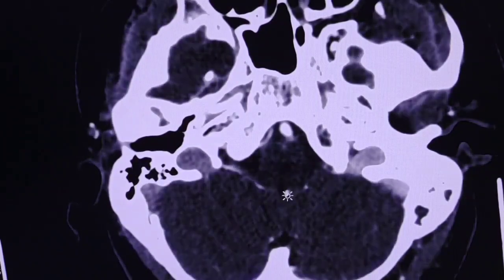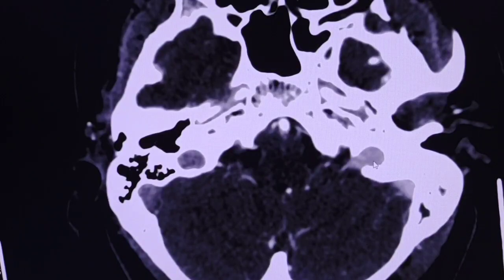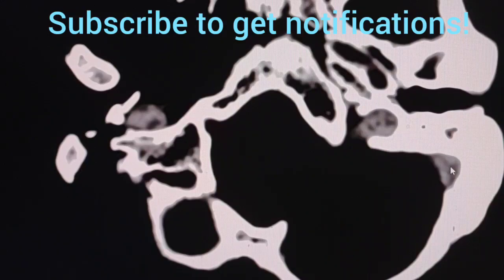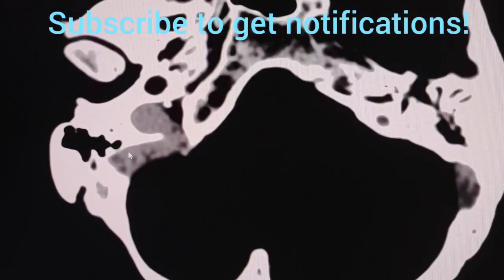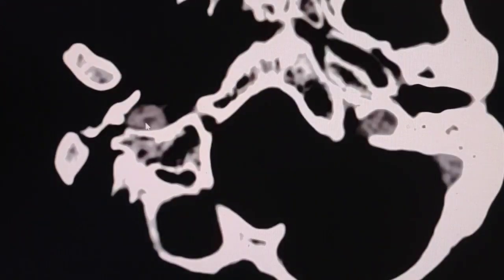However, in this non-dedicated CT scan, there was inhomogeneity and some filling defects in the venous sinuses. So, CT venogram of the head was performed to confirm the diagnosis of the venous sinus thrombosis. Here is the CT venogram of the head. Just have a look in the sigmoid venous sinuses, right and left, and the jugular veins, right and left, and you can see that there are multiple filling defects starting from the jugular veins. So all these filling defects represent thrombotic elements, thrombosis.